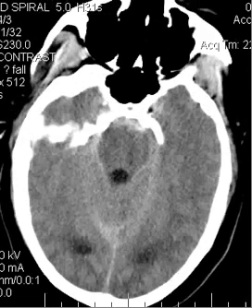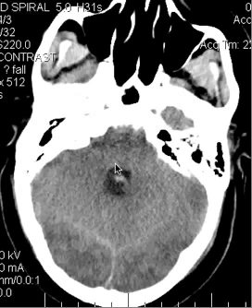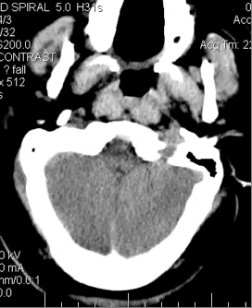Let's go down a little bit lower, and you see a lot of blood in the prepontine cistern. Look in the fourth ventricle. The fourth ventricle is dilated. See that? It's abnormally large. And you have this high attenuation material. That's a blood clot in the fourth ventricle. Okay, so that's all the findings of subarachnoid blood, and very often the blood gets into the ventricular system.